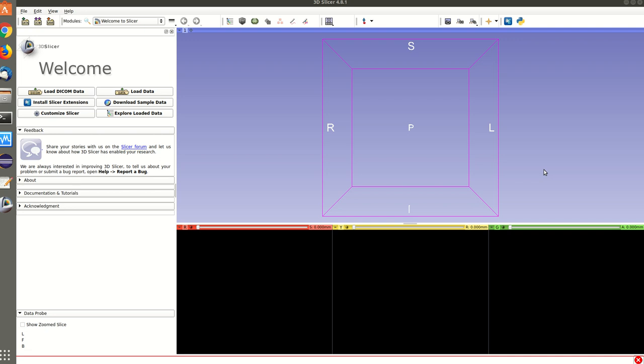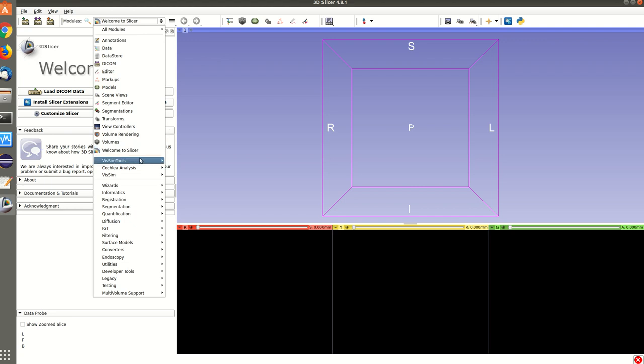Hello everybody, my name is Ibraheem Al-Dhamari and today I'm going to show you how to do Cochlea image registration using 3D Slicer, the stable version 4.8.1 and our 3D Slicer plugin with some tools for Cochlea registration.